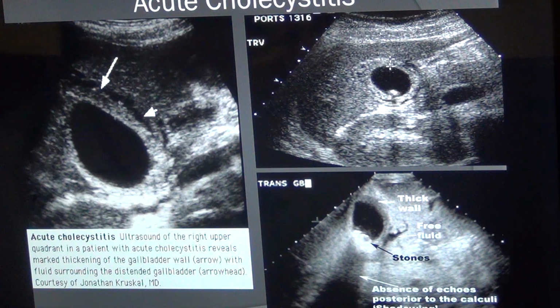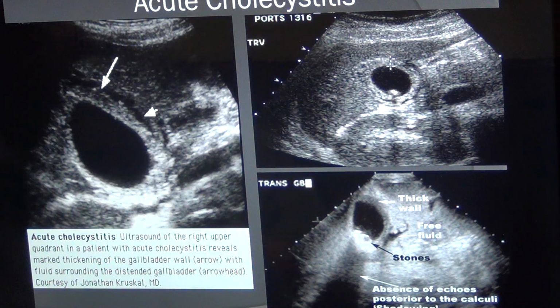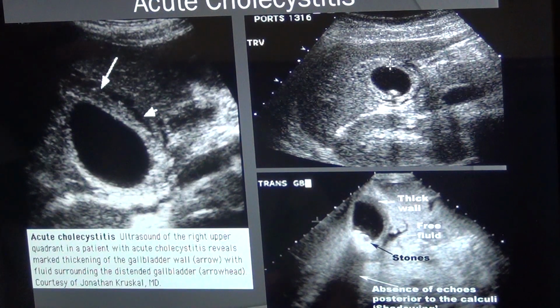Gallbladder contains bile. Bile is a chemical material. So that will cause intraperitoneal infection, generalized infection. We call it general peritonitis. Our body will try to conceal the bile, but it is not always possible. And in gangrenous condition, you will see a lot of cellular debris inside the gallbladder wall.